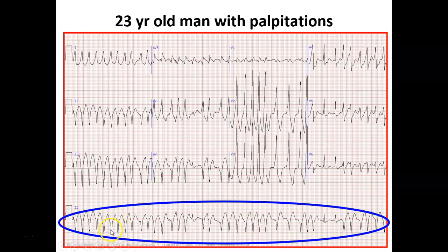If you see, it's the same shapes. So no P wave, but these are the wide complexes, but they are irregular. So maybe atrial fibrillation. Okay, and if you see the morphology, this is a right bundle branch block pattern.